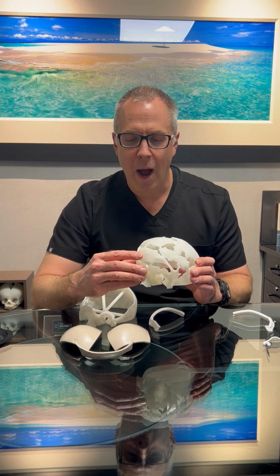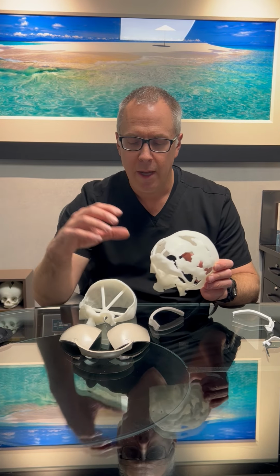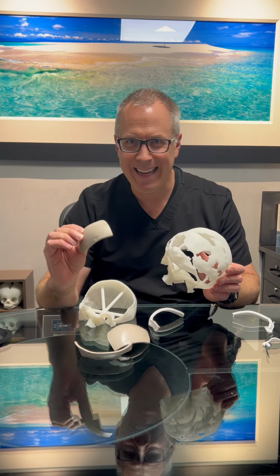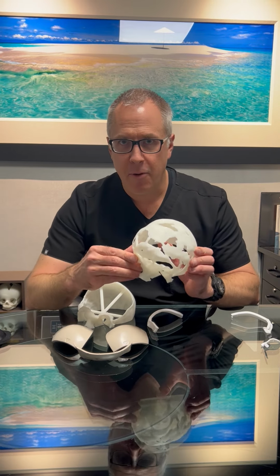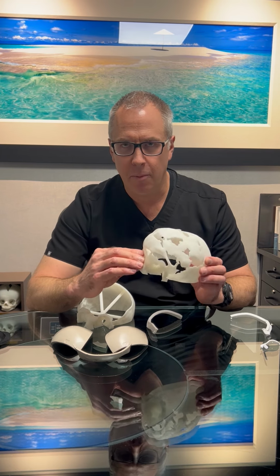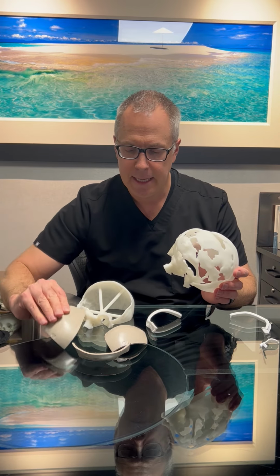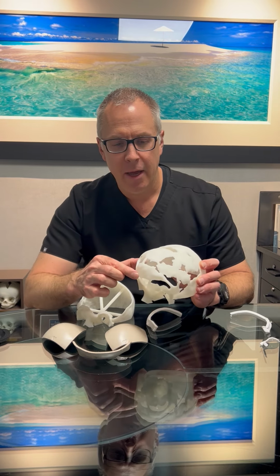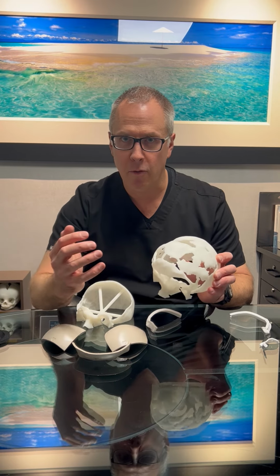So although I generally like to reconstruct bone with bone, in this case, we're going to have to use modern technology and what's called a PEEK implant, so a synthetic implant. So 3D printed model of the patient's CAT scan. We did a virtual surgical planning meeting with the company that makes these plates, and using computer models and imaging, we told the company where we want to make the cuts, what bone we want to remove, and how we want to reconstruct it.